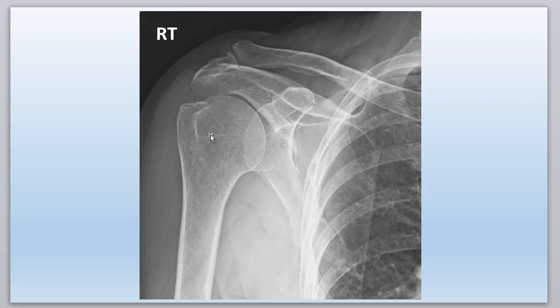And then now this is, of course, the humerus. This is the humeral head. If I could draw a line through here, and we have some slides coming up that'll be a little more specific, that would be the anatomical neck. So this is the head of the humerus, anatomical neck of the humerus.